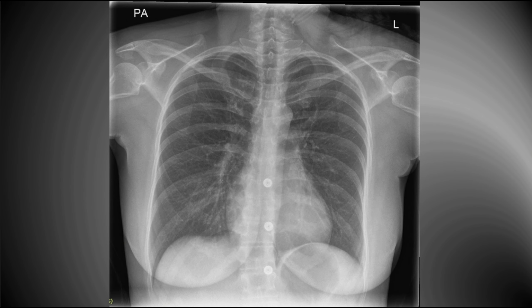This is a standard chest x-ray. Now this is taken from the posterior to anterior perspective. I'll explain what that is in a minute, but this is the kind of x-ray that you'll see in an outpatient, someone in your clinic, or even someone coming into the emergency room that's able to stand in front of the machine. There are various things you need to recognize on the chest x-ray, so let's work our way around.